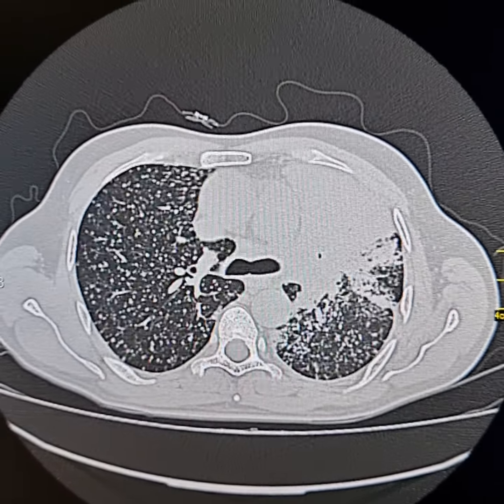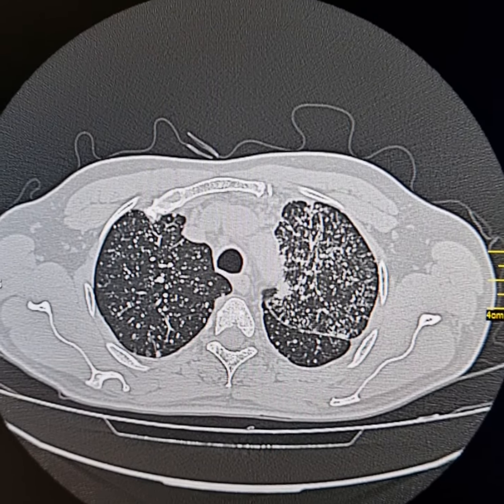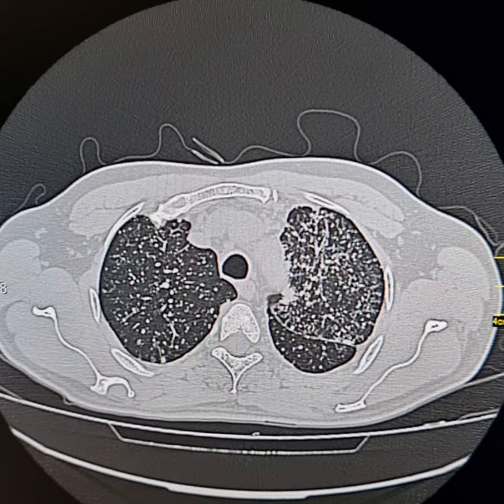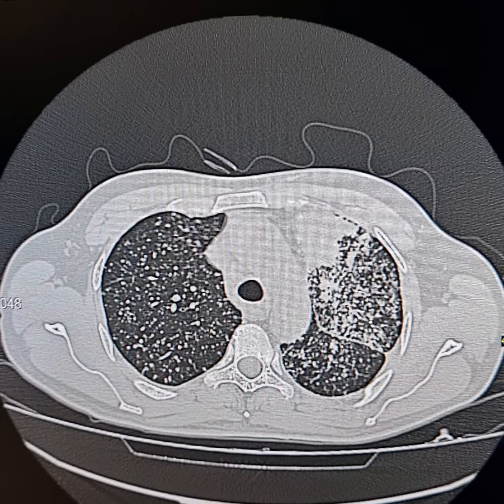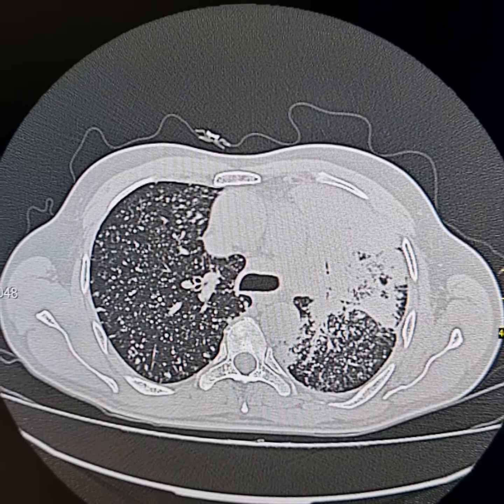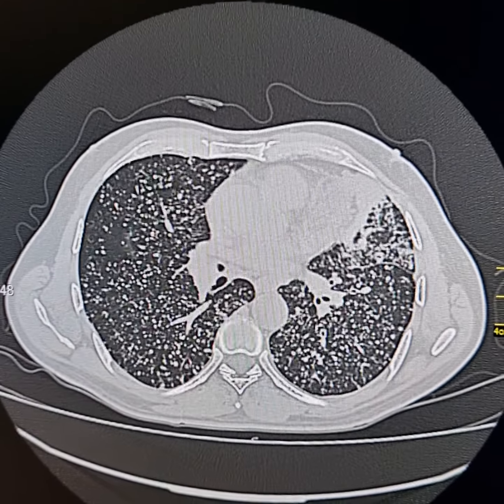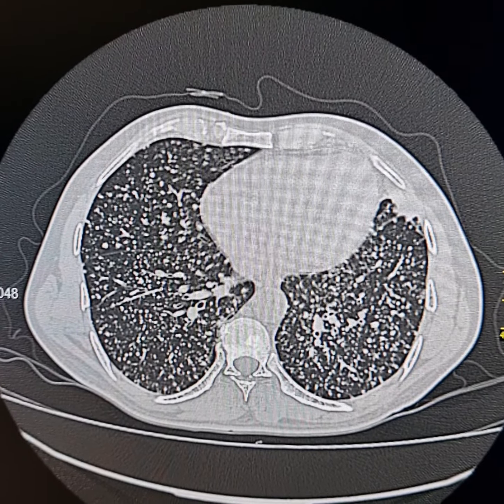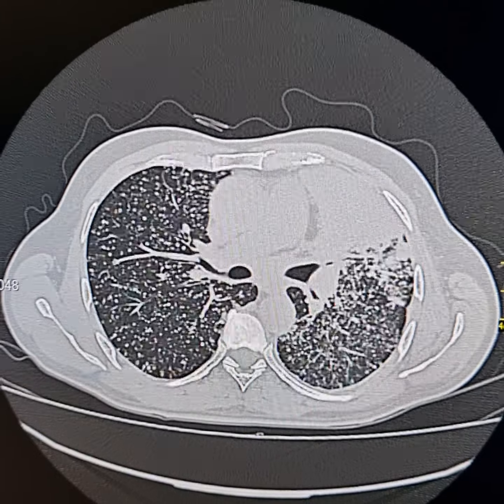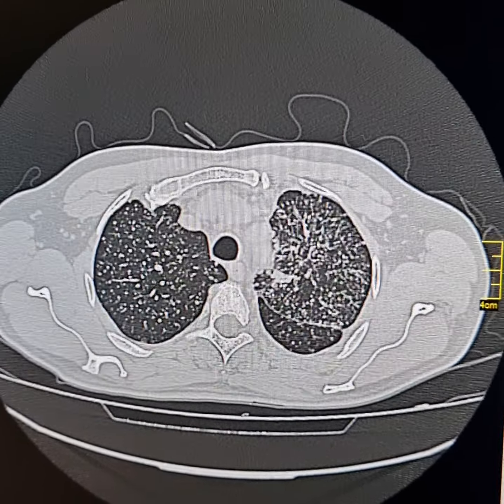I wish a contrast-enhanced CT scan was carried out in this particular patient. In fact, in the private practice setup, you have to do whatsoever is advised by the clinician, and most of the times clinicians do not know what the indications of HRCT or a contrast-enhanced CT are and what benefits they can get out of the contrast-enhanced CT. Similarly, in this patient, only HRCT was advised and so it was carried out.